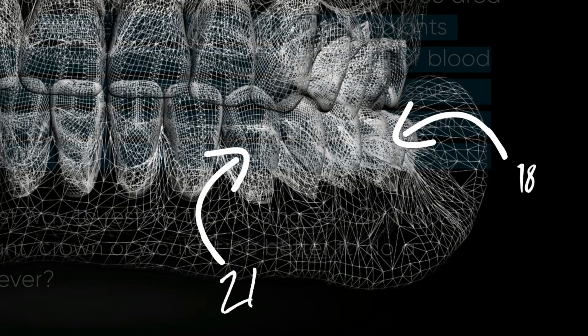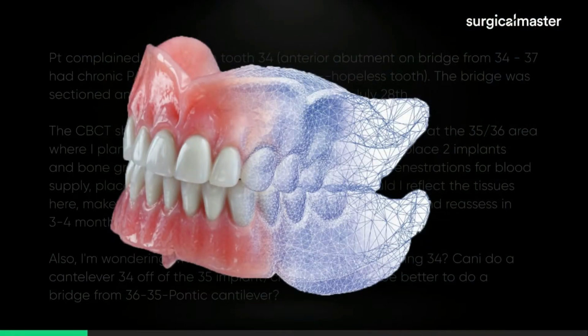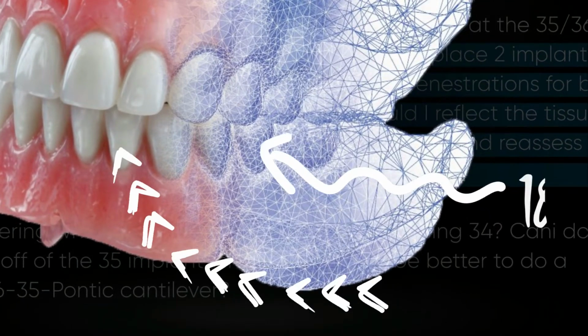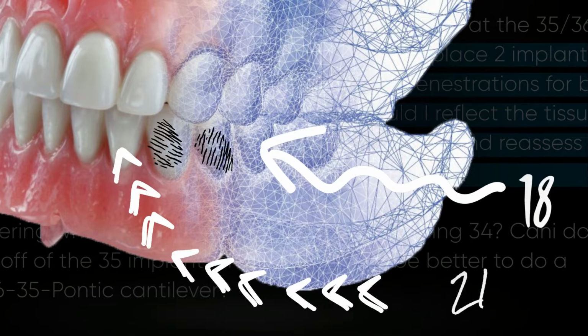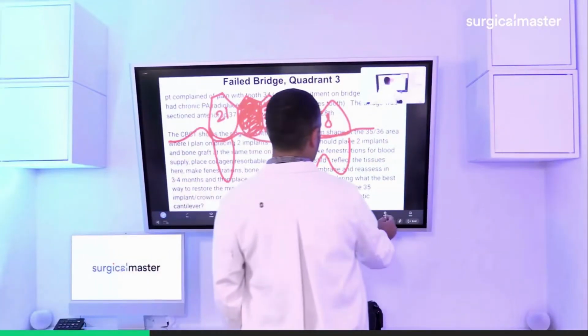Great. So that's basically, if I had seen this periapical, I would have had immediate clarity about what's going on. Now I can go back in my memory and look at those cross sections. I think the molar had more volume, the premolar had less. So chances are, now that 21 is gone, and assuming 18 is in good shape, and by the way, we wanted to look at the periapical to assess 18. Maybe 18 is a liability. Maybe we need to vacate 18 site as well to clear the quadrant, give us a good chance for healing.